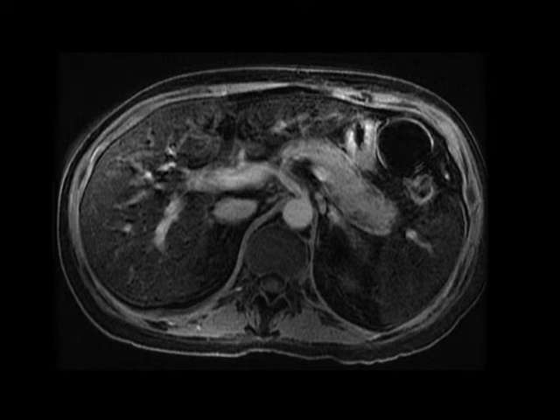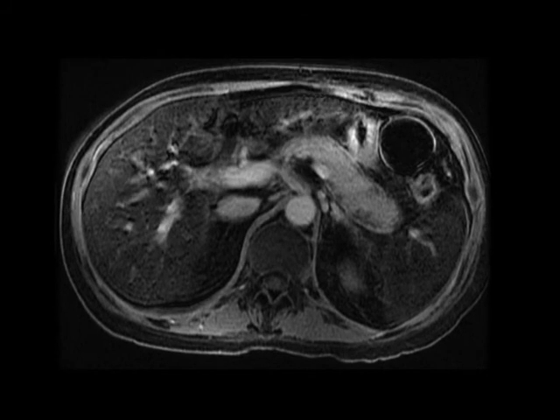Now, while these patients can have a varying degree of different imaging findings, often they're going to have diffuse enlargement of the pancreas with a so-called sausage appearance as a result of that bulbous appearance of the pancreatic parenchyma, and they'll often demonstrate this low signal intensity or low density rind of soft tissue surrounding the pancreas, which will demonstrate delayed enhancement on either venous or delayed images.